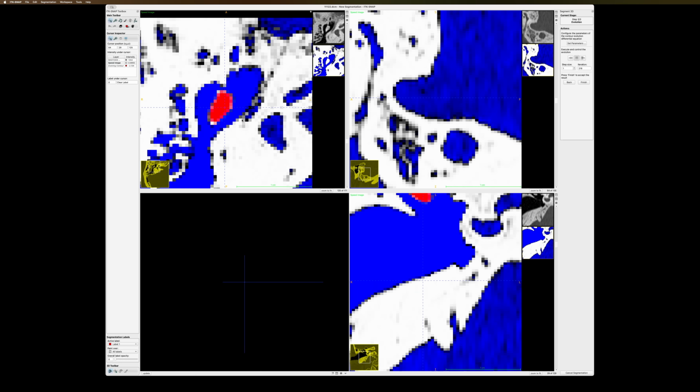be highlighted or taken into the 3D model, because the ossicles are small and typically with the program they won't be selected because they're not connected to the rest, or at least their connection is very small. See how in this case the program automatically selected just the ossicle and didn't select any of the other bones around it.